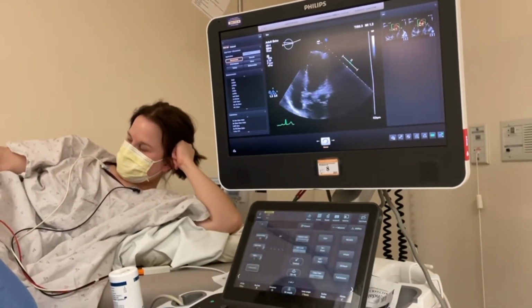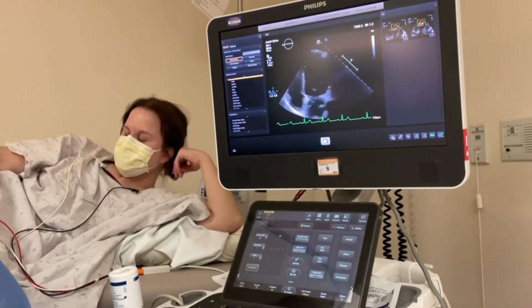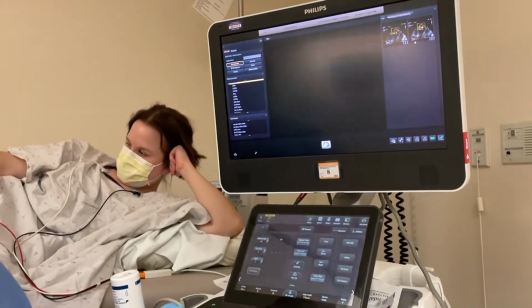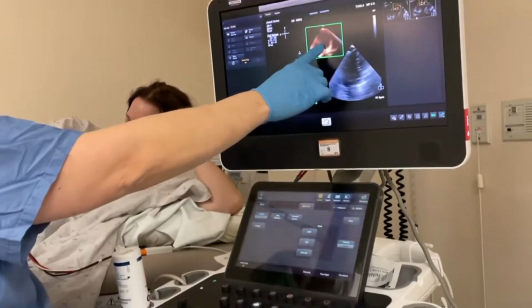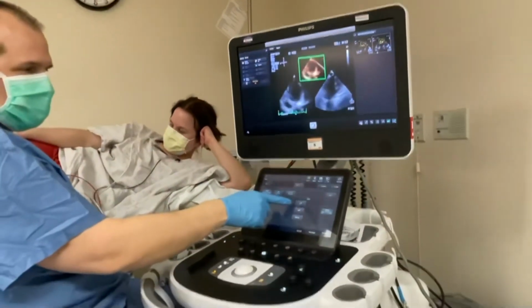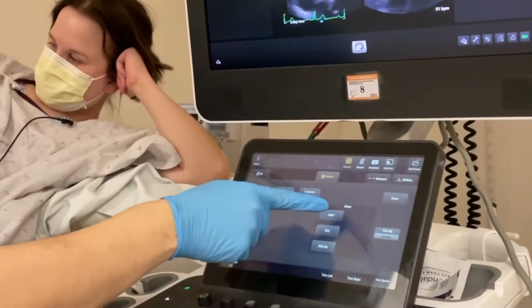So we'll hit 2D, and to get into this, we'll hit our model with our pointer, double click, and now we have our two segments with our volumetric set there. We'll hit dynamic heart model, which is the software we have with this machine.